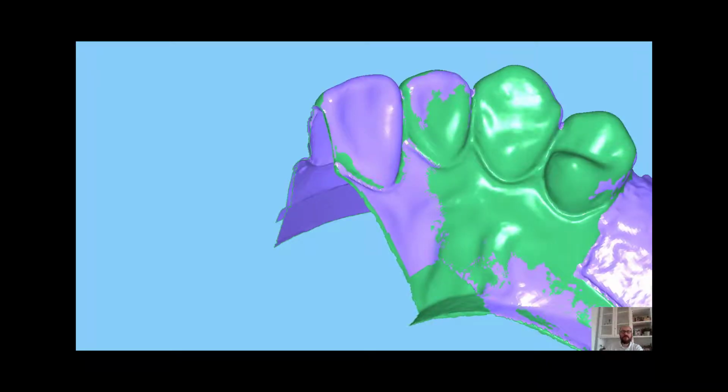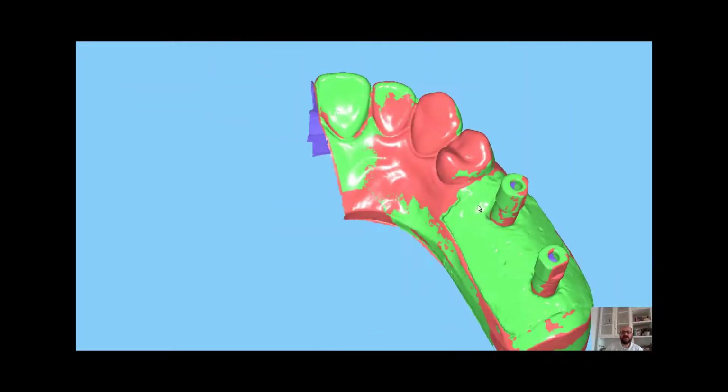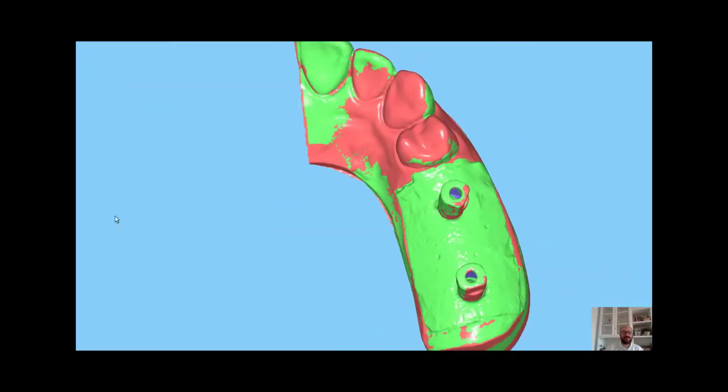But it's possible to refine this result thanks to the global registration. In the global registration, the software is asked to move the floating mesh in order to achieve the best fitting between the two meshes.